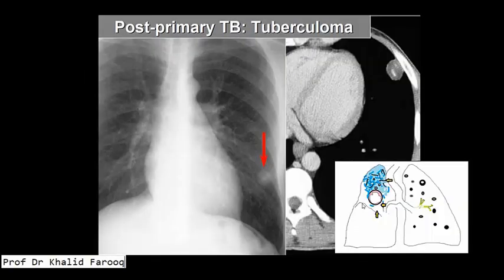Here in this X-ray we have a small nodule, or we can say it is a solitary pulmonary nodule with a tiny high density focus in it. When we did CT, we can see a peripheral subpleural nodule in the left lung where we can see tiny high density areas suggesting calcification in its parenchyma, favoring calcified granulomas.